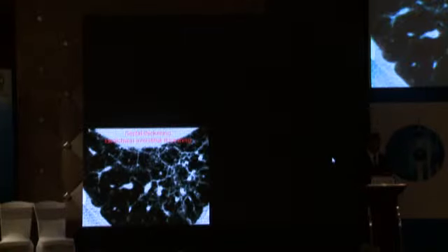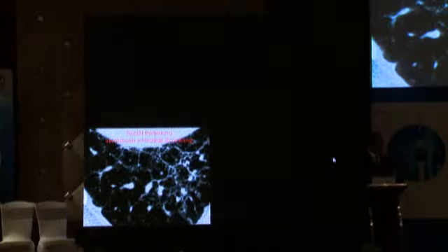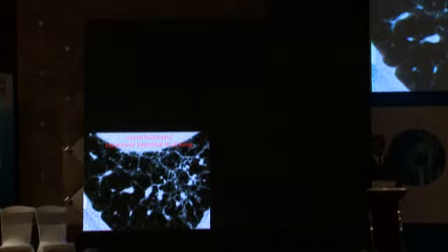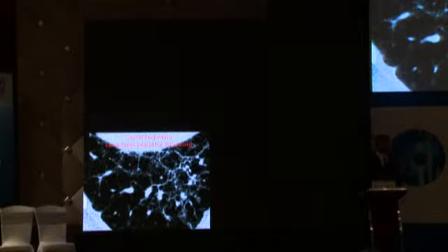Spend a couple of minutes then on the basic anatomy and pathophysiology of interstitial lung diseases. We have an anatomic unit called the secondary pulmonary lobule, which you can see here as a hexagon lined by these interlobular septae. In the center is a vessel which is white. Next to it would be a feeding bronchus that then divides into 4 or 5 terminal bronchioles, each of which divides into respiratory bronchioles, then alveolar ducts and sacs. When we see the secondary pulmonary lobule, it means that this is abnormal. Either there is septal thickening or there is some other reticular stuff that is happening.